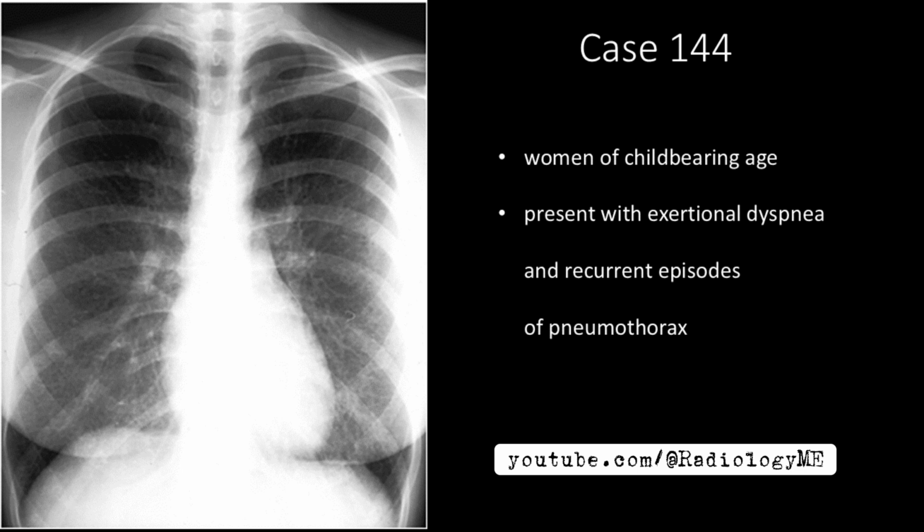Starting with the chest X-ray, we notice that the lungs appear to have large volume with some abnormal architecture. It almost mimics the pattern you'd see in emphysema with a more hyperinflated look. There are no obvious consolidations, but with this abnormal lung appearance, we need to think about potential underlying causes. This warrants further evaluation with a CT scan to get a clearer picture.